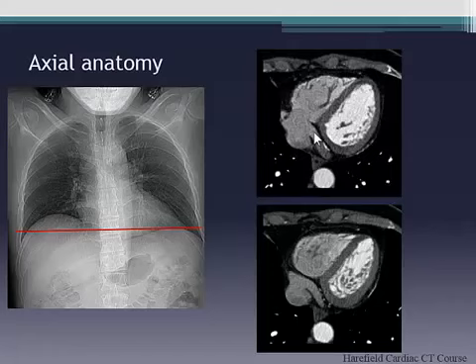so you can identify the relationships as to whether they're normal or abnormal. So it's a really useful skill to do because it forces you to look at the image as if you were looking at an echo. And similarly, if you're from an MR background, it will get the 3D anatomy sorted in your head and also force you to look at it in the same way. So, for example, if you do a 2-chamber, you'll see the coronary sinus right up against the left atrium.